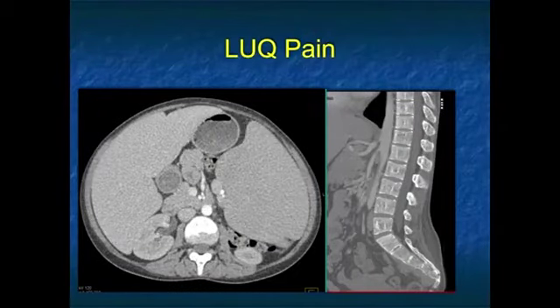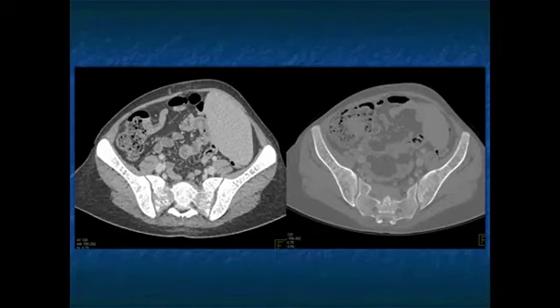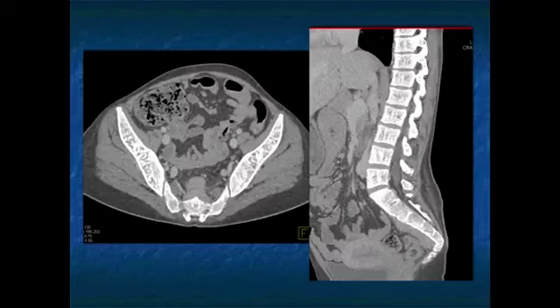Another patient, big spleen. Then you see textural changes in the spine, and you can see it's almost like a bone-in-bone appearance. You look at the images a bit further down, there's textural changes in all the bone, including the iliac bones and sacrum, and soft tissue mass in the presacral space. So now a big spleen, bony abnormalities, soft tissue in presacral space, and that appearance in the presacral space is very suggestive of one thing, and that's extramedullary hematopoiesis.